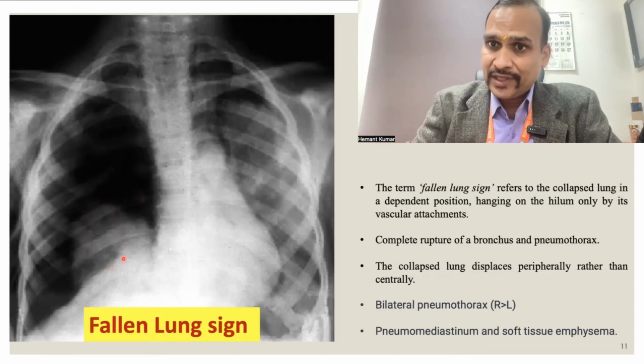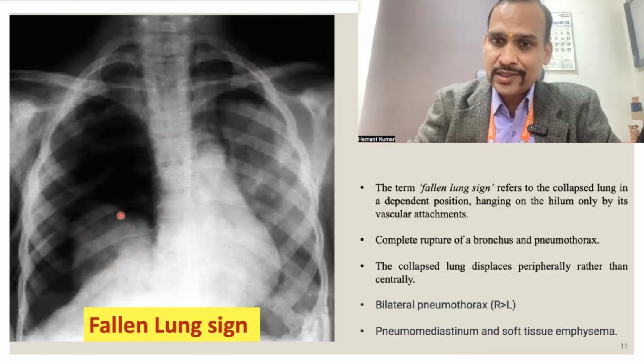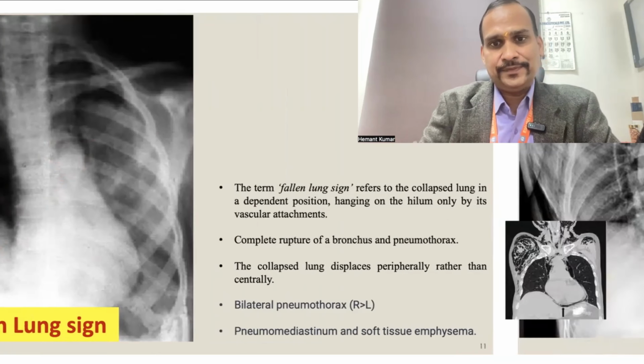going down. In this X-ray, you can see there is bilateral pneumothorax. Pneumothorax is here also in the left side. So in this X-ray, bilateral pneumothorax and pneumomediastinum.